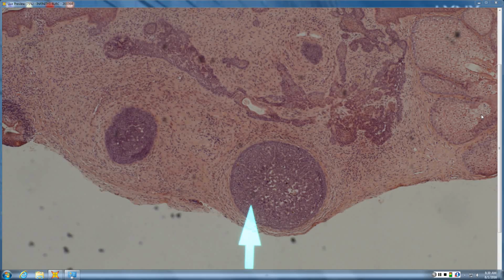It's going to be palisading blue cells, so the epithelium looks like a basal cell. The difference is the stroma: no retraction space, not fibromyxoid, concentric and fibroblast-rich like the follicular sheath, and then papillary mesenchymal bodies out in the stroma.